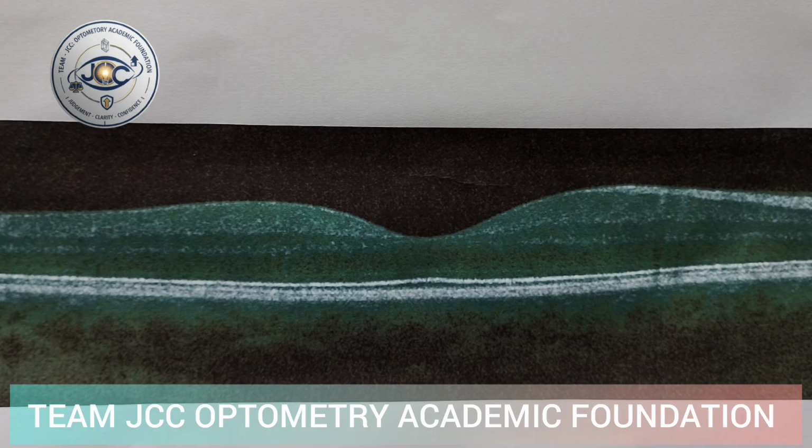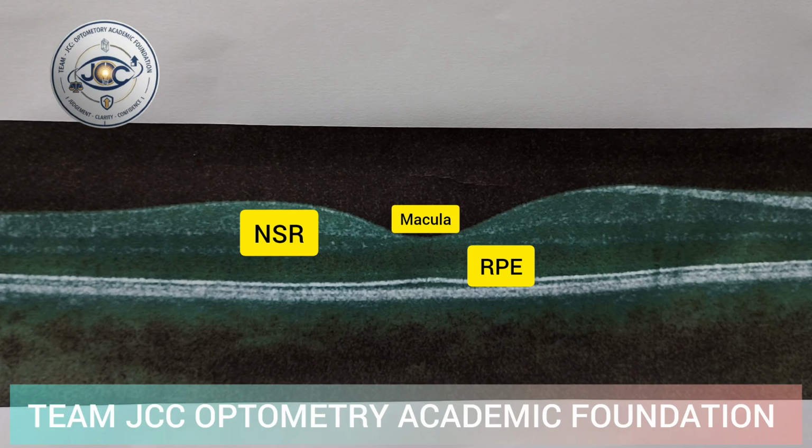So in the OCT scan, we need to see how this macula is presented, and also whether the neurosensory retina is attached to the RPE layer or not attached, meaning there is a gap between them. We need to find that out.